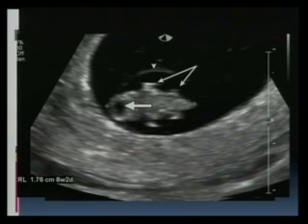And what is this structure here, Jared? That's the yolk sac. Gestational sac. This is the gestational sac. Abhishek? Very good. This is the amnion. So what is an amnion?